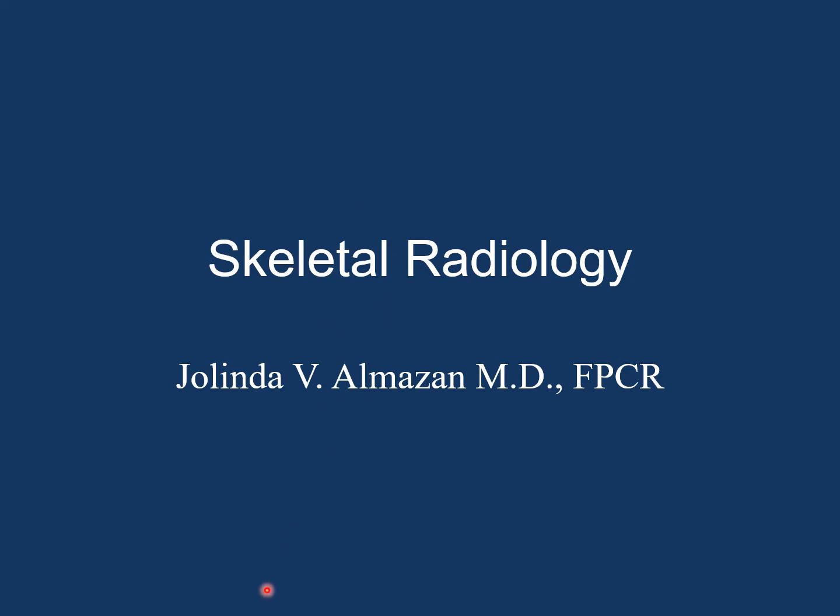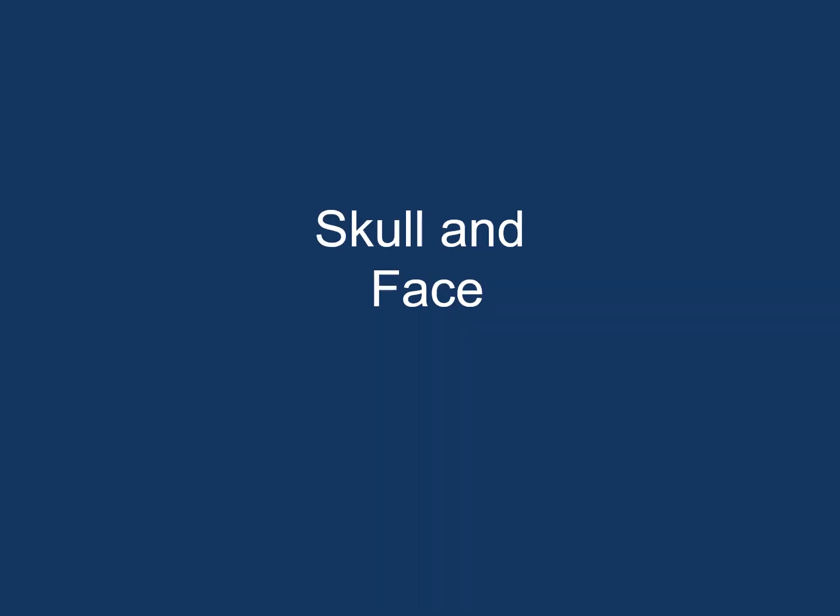For this session, we are going to talk about skeletal radiology. I will be dealing with the normal appearances of the bones as well as the pathological findings such as fractures of the bones. I'll start from the skull down to the foot.